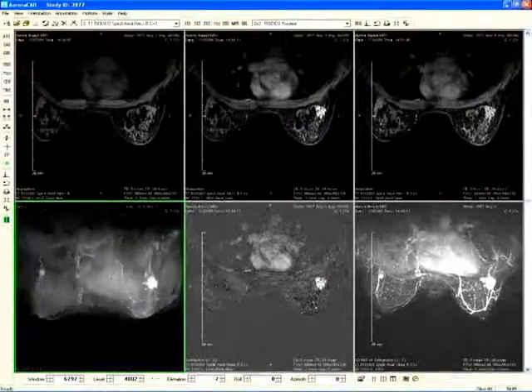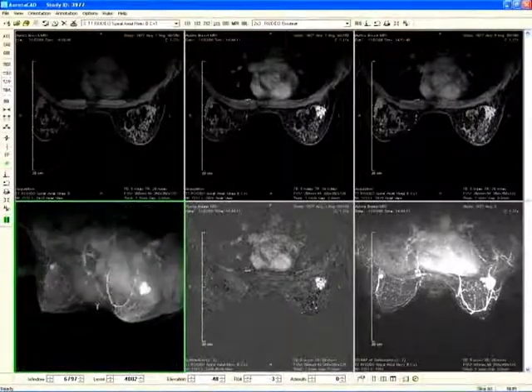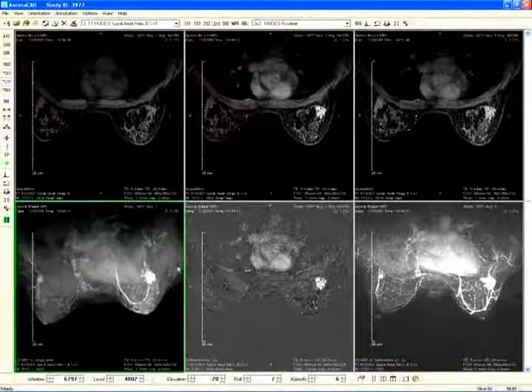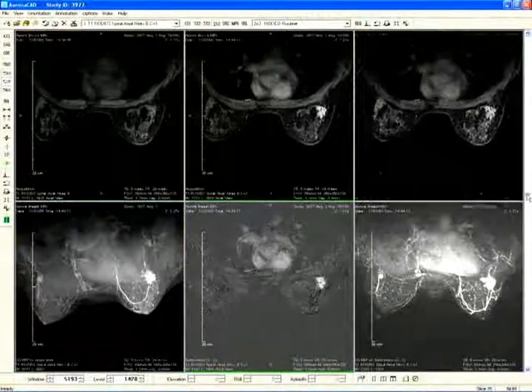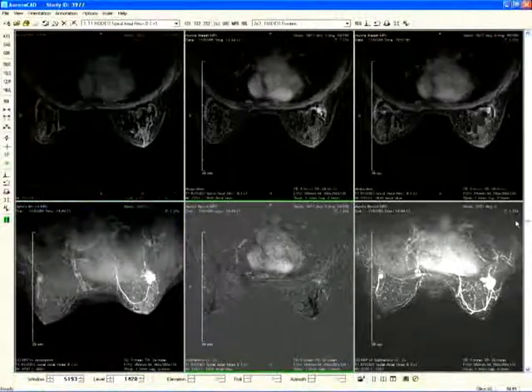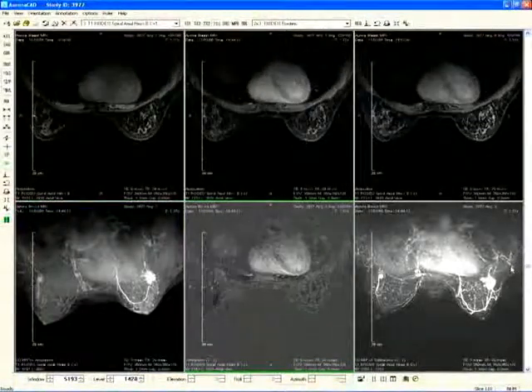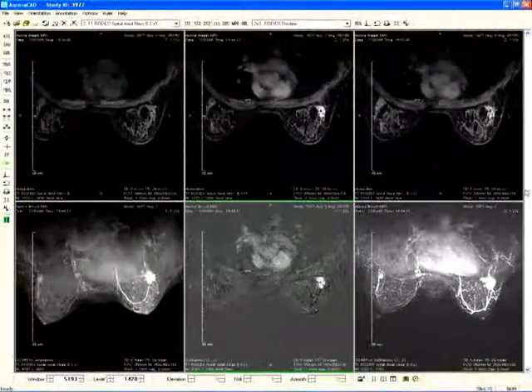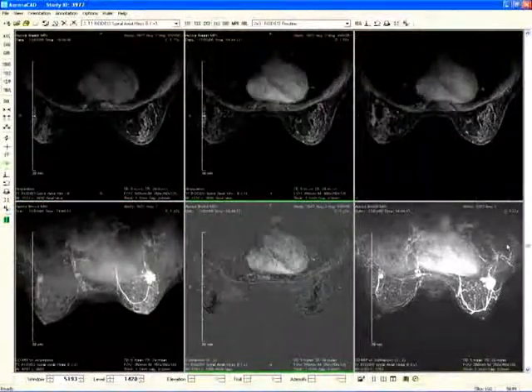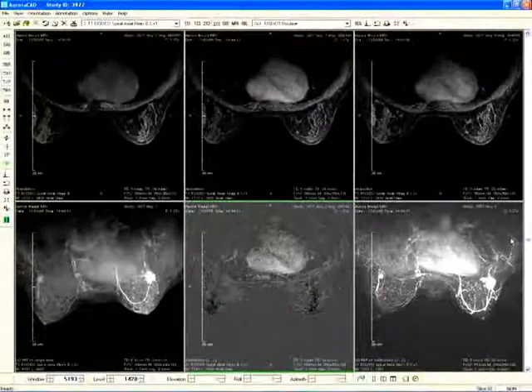The Aurora system has a special registration program that evaluates the image in all three planes and accounts for the non-uniform deformities that can occur in breast shape with movement. This registration program is where the heavy computer horsepower of 4 parallel processing chips comes in handy.